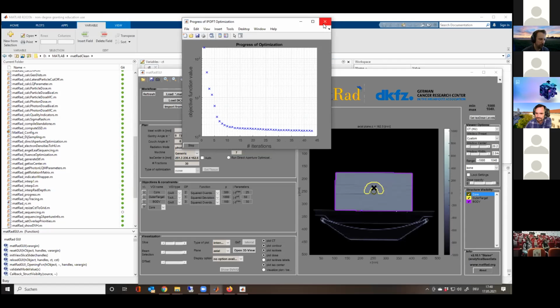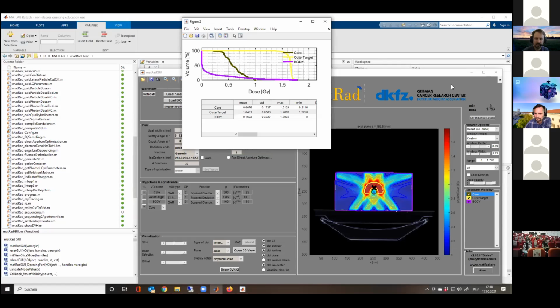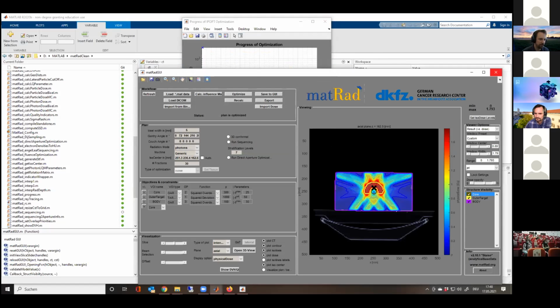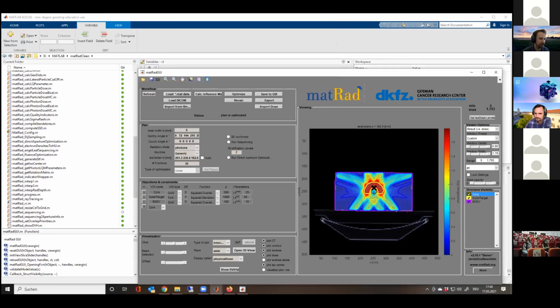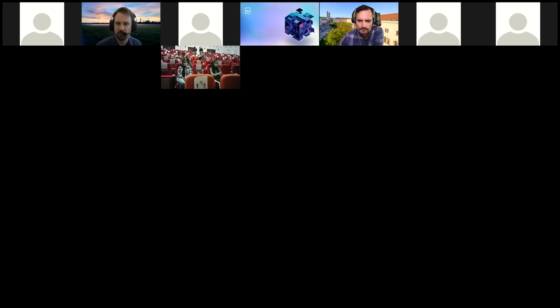So maybe, for those who have the code installed and want to play around with it a little bit, there's a chat. Always on the Mac, I can't find application inside MatRad. So maybe Hans-Peter, you have something that's going on there, but I don't know if the bug report gives enough information. So have you installed it correctly?